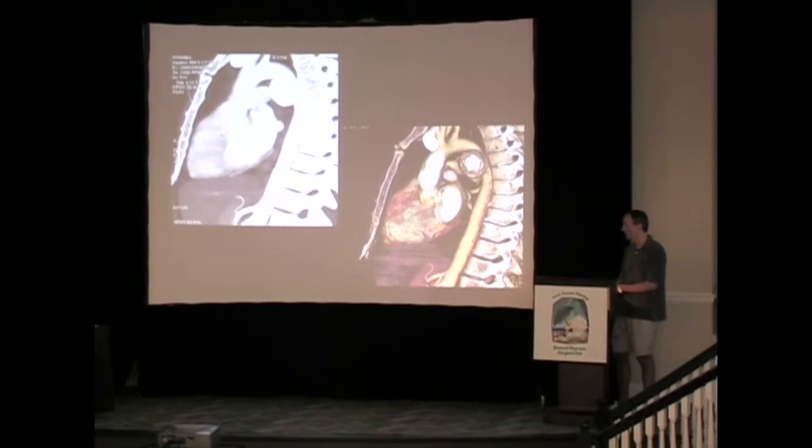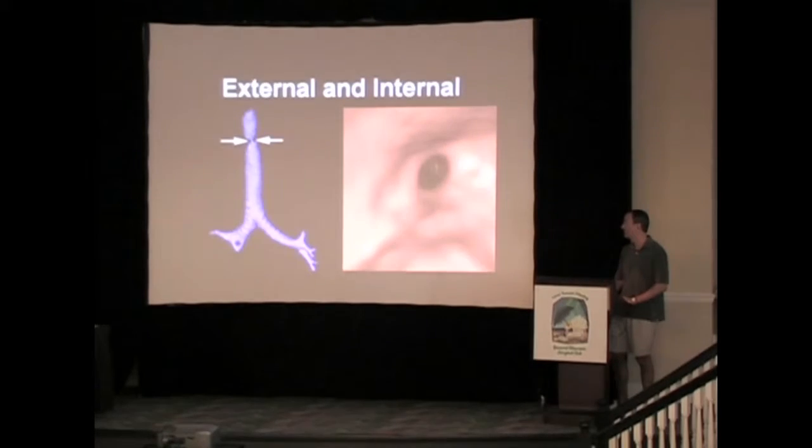And just to give you a comparison, these are the routine multiplanar images that can be done on any CT console, and don't require a workstation. You can get a nice demonstration of this aorta and the pseudoaneurysm, but you'll see with the 3D image you get more of a sense of depth perception, which is absent on the 2D image.